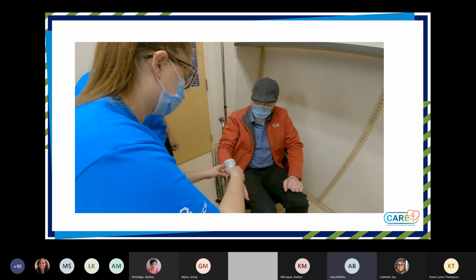The integration of Meditech's lab application data files immediately to blood bank. The information readily available in the EMR blood bank panel. And the reports are available in blood bank as well regarding transfusion administrations.